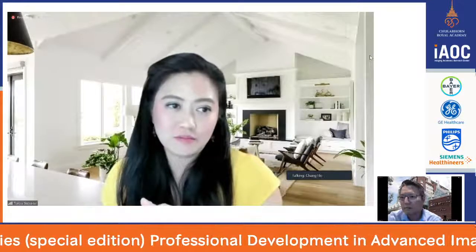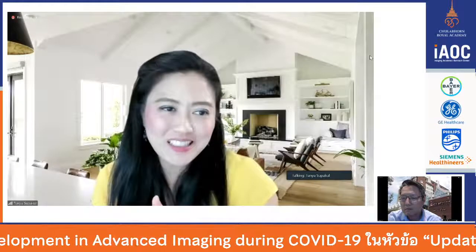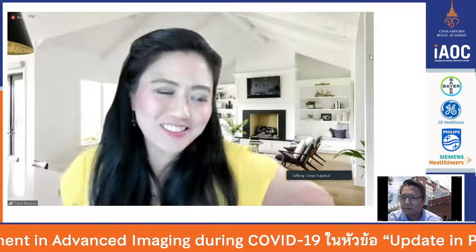So you would recommend the DSC? Yes. As the initial study when the patient comes and we see a tumor, and we do some grading. So DSC is a yes. And how about spectroscopy? Do you think it's value added, or is probably not?